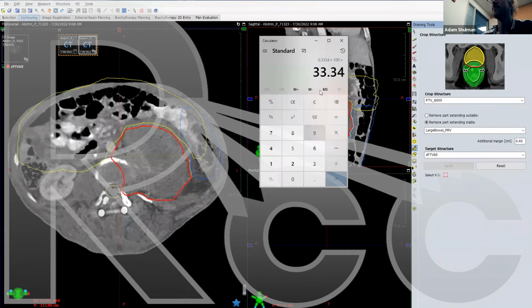Now, just to remind you, we could say divided by 5 and say it needs about 7 millimeters. But remember the rules of thumb. So we've got 5% per millimeter for large structures up close, 3% per millimeter when it gets a little bit further away. If you remember our discussion of our ring was 65% at 1.3 centimeters. So let's see, if you look at the 40 divided by 60, that's about 65%. That's similar to our second ring that's 1.3 centimeters away.